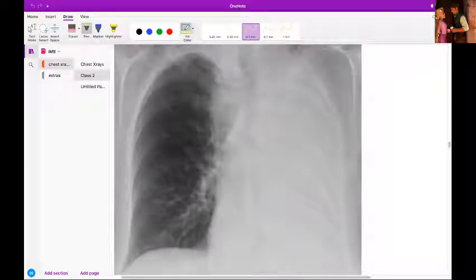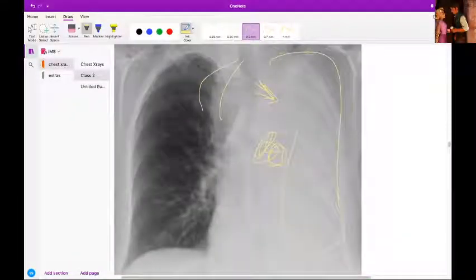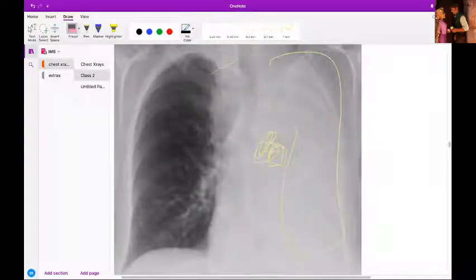The reason you can tell this is not pleural effusion is that the trachea is deviated towards the side of the lesion. If it was deviated away from the side of the lesion, you would say it's pleural effusion, but since it is deviated towards the side of the lesion, it is actually atelectasis. Suppose there's some bronchial mucus plugging of the left bronchus itself, and then the whole lung has atelectasis. So this is total lung atelectasis. There's a question like this in UWorld, which everybody gets wrong because everybody calls it pleural effusion.